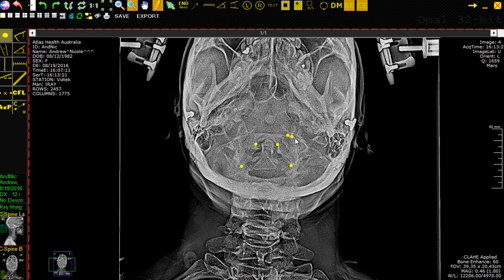Personally, what I do is I make just a bunch of dots along the margin like this to be able to identify where this lateral mass is, and then the same thing as it comes out here. Now, for programming purposes, I don't think you need to be able to identify exactly where it's going to be, but I just wanted to show you that this is a general rule of thumb, the type of feature that we are actually looking for on the C1 vertebra.